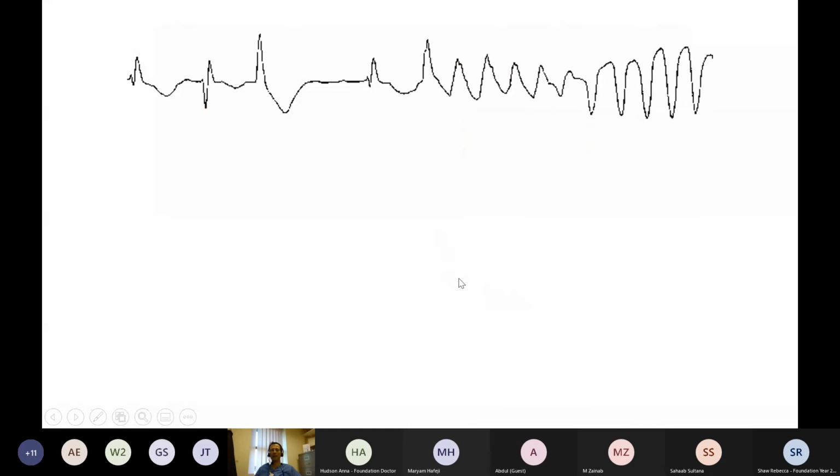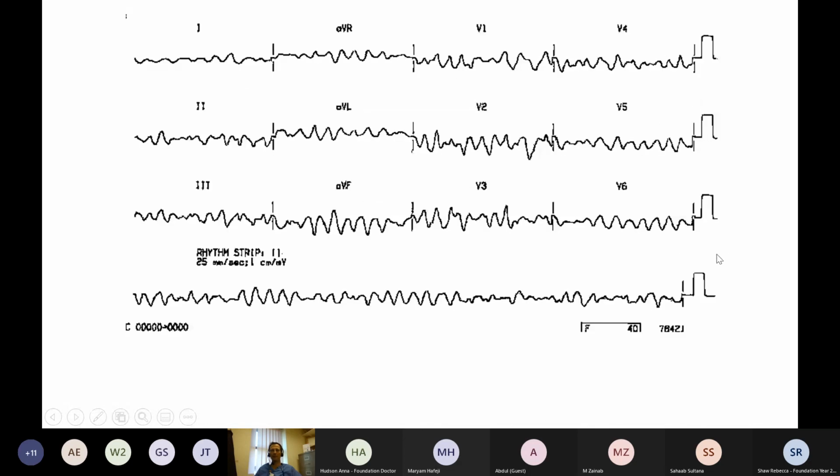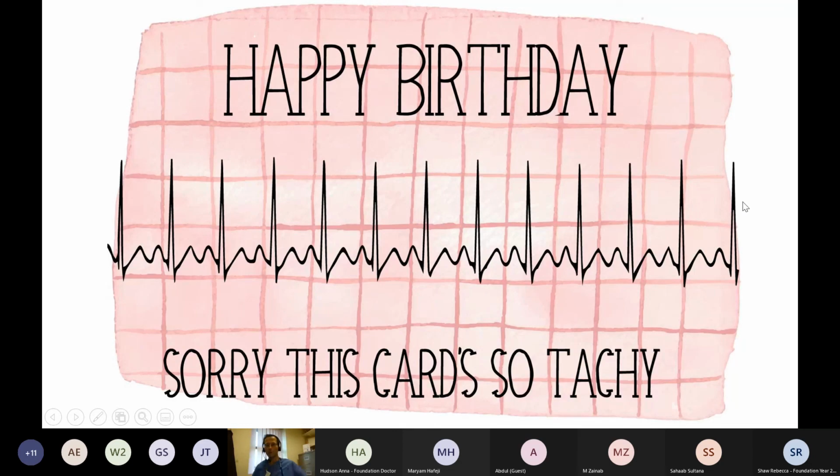thing. And one other ECG I want to show you is torsade de pointes, where it's corkscrewing round and round a point. And the very final one, this is the ECG you don't want to record. This is ventricular fibrillation. Wonderful.